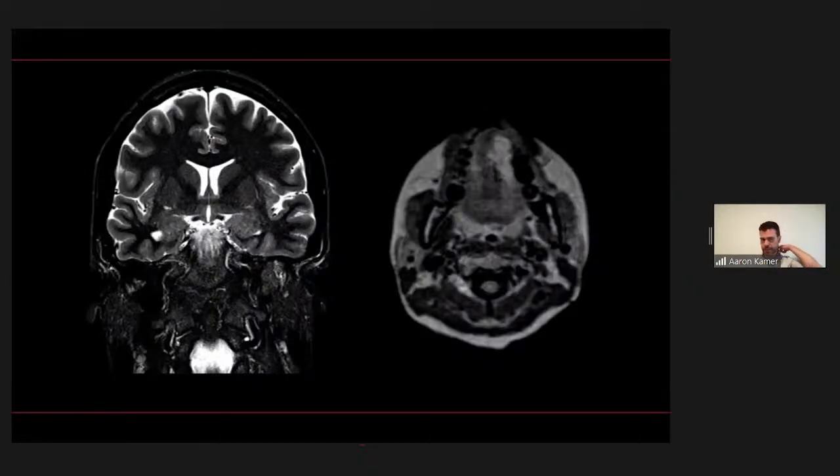Okay. So I think it was this case that I had mentioned in my report. I said that there's increased size of the amygdala on the left, highly suspicious for isolated amygdala enlargement as a cause for the patient's epilepsy. In that neurologist's report, he had noticed that the right temporal horn was bigger than the left, and being very focused, like a lot of us are if we haven't looked at a whole lot of epilepsy imaging, he was very focused on diagnosing mesial temporal sclerosis.